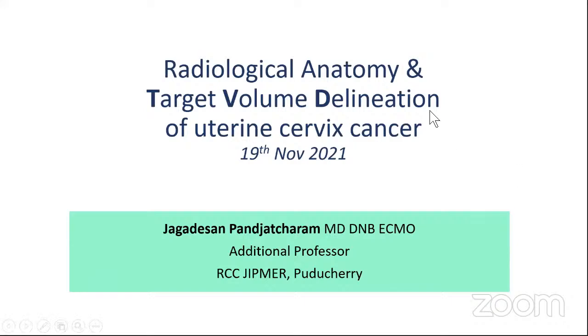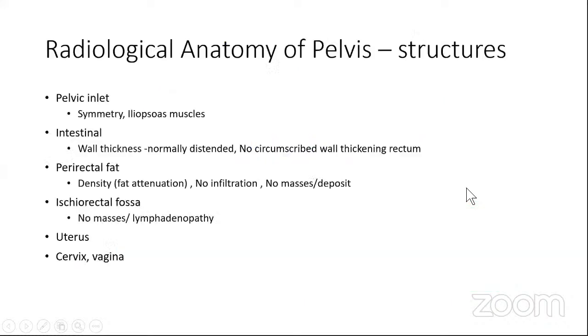Okay, thank you. So today we'll discuss, I hope you have been following a series of lectures on different cancers. Today we'll look at the basic principles by which we proceed with contouring a cervical cancer for an external beam radiation treatment plan. The brachytherapy part has already been covered, so I'm not going to share overlapping zones. We'll try to be as brief and as clear as possible for an EBRT plan.